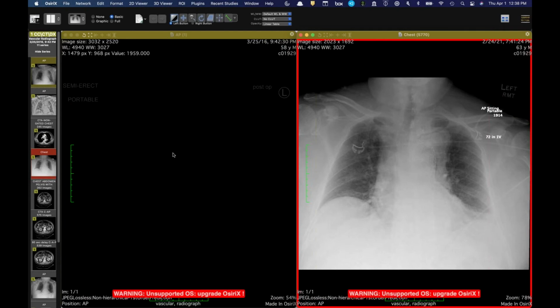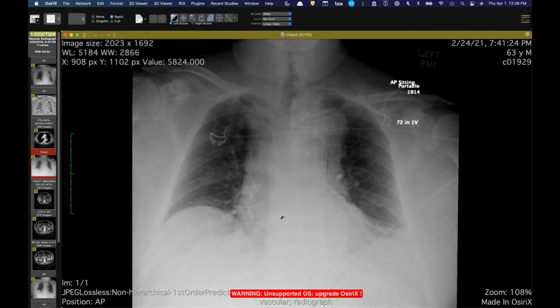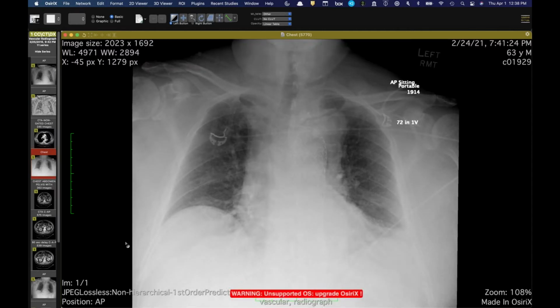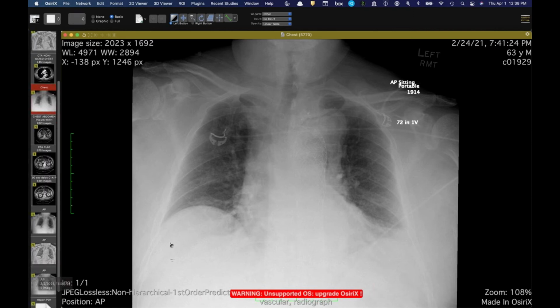Let's see, that was 2016. Actually, I can get rid of that. This is 2021. And anybody want to comment on the new finding they see on the radiograph? This guy's had worsening back pain for 6 months and some B symptoms.